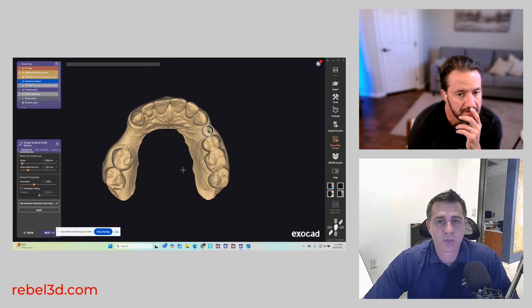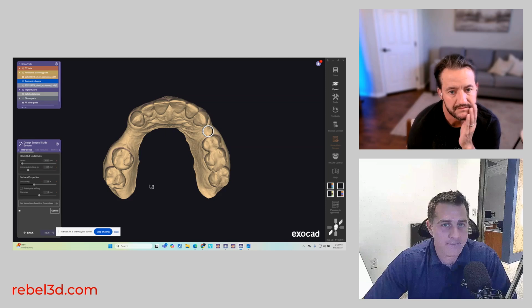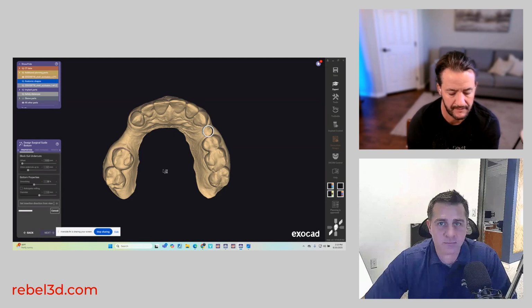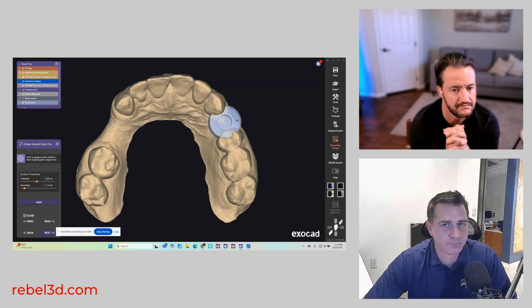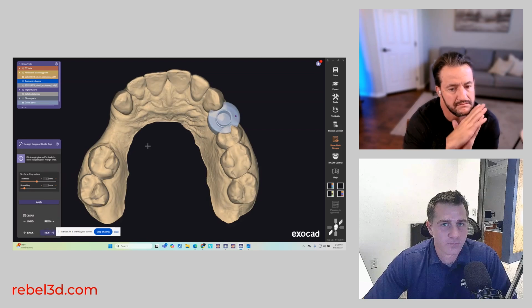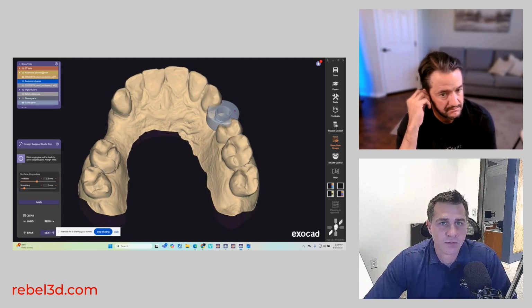So this is where we're going to do our virtual bottom here for the guide. And now we can start marking how we want to design our guide. So let's start marking.